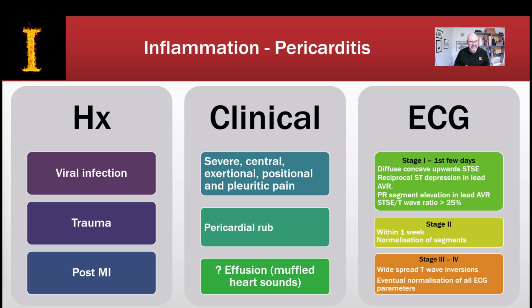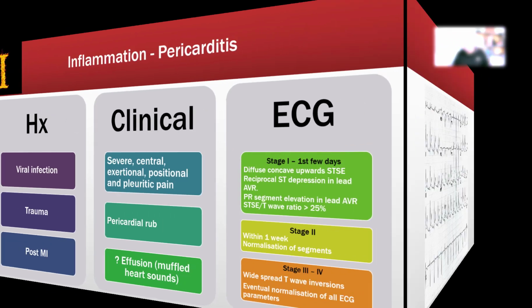In the case of pericarditis, the other change which is quite often apparent is PR segment depression. When the inflammation resolves, so do the currents, and the ECG returns to normal. The majority of pericarditis presentations are caused by viral infections, with upper respiratory tract infections and gastroenteritis being the most commonly clinically apparent prodromes. So let's go on to have a look at the ECG findings.